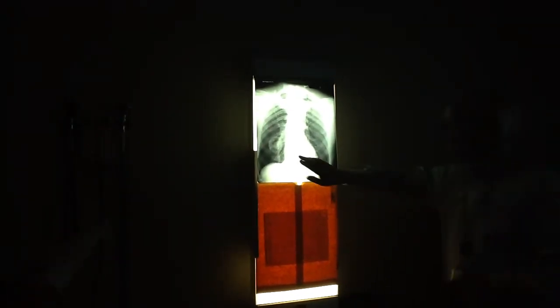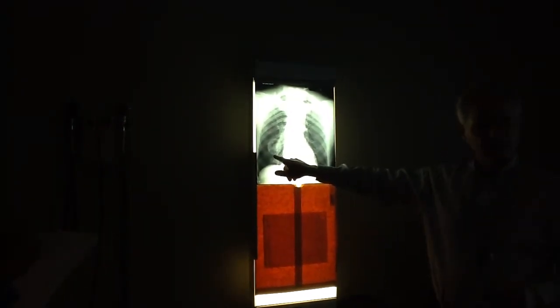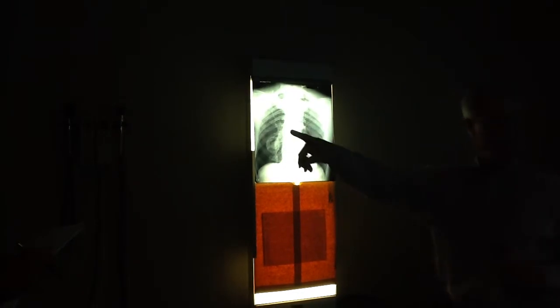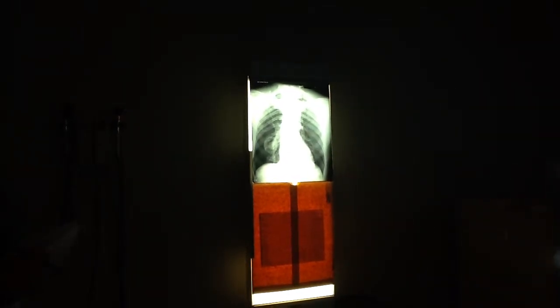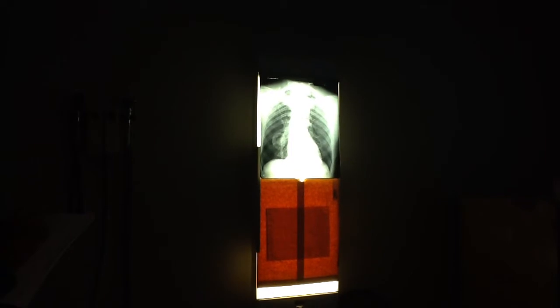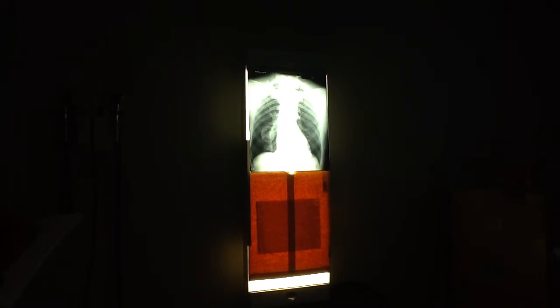All right, so let's look at this one. This is an abnormal density. So how does that differ from what we've been looking at here with these silicosis examples? Unilateral, localized. Yeah, the density is completely different. Still water density, but where these others were bilateral, widespread, non-homogeneous, this is very localized, isn't it?